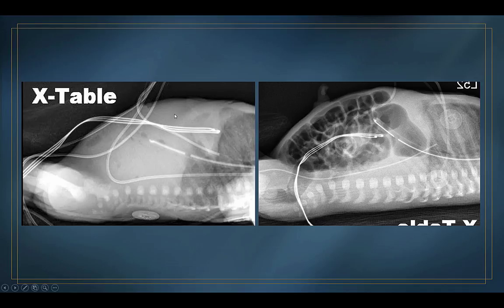This is a neonate that doesn't have a lot of bowel gas, and this is one that has bowel gas everywhere. But even when you have a lot of diffuse bowel distension, this portion of the peritoneal cavity is the most anterior. So that is where free air will collect first on a cross-table lateral.